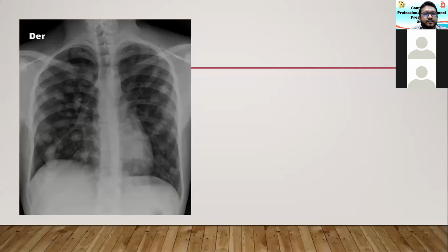Okay, if you look at this X-ray, it's obviously abnormal. And if you see what the abnormalities are, they are well-defined rounded nodules involving all parts of the lung. You can see that they are well defined, the outline looks very nicely demarcated without any spiculations, and they are distributed all over the lung field. This is full-blown pulmonary metastasis.